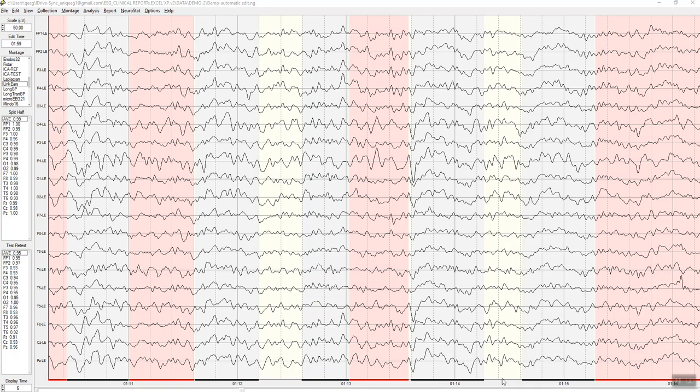This is a training film or movie on the new development in NeuroGuide with the NeuroNavigator and the ability to now look at the sources and the connectivity of the cerebellum, the red nucleus, the habenula, the subthalamus. And we've already had the thalamus in the previous release, but this is a pre-release version of 3.0.6.3 that allows us to import research data to evaluate the cerebellum.